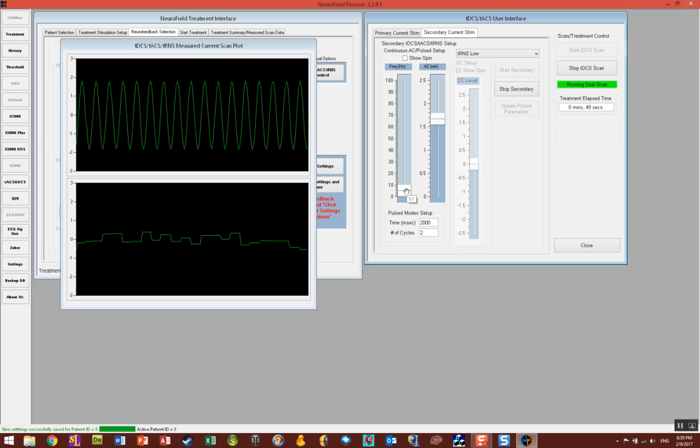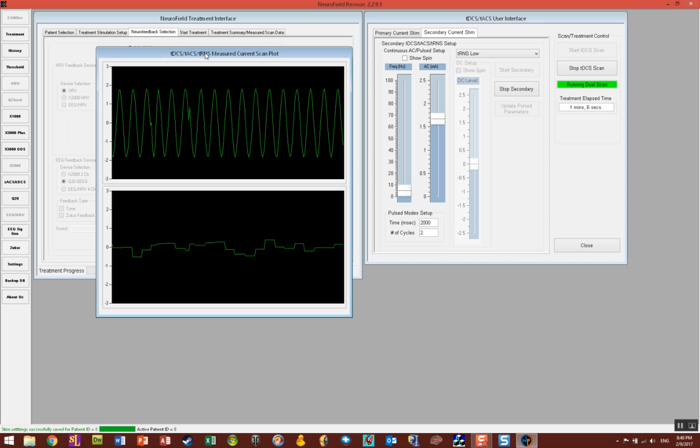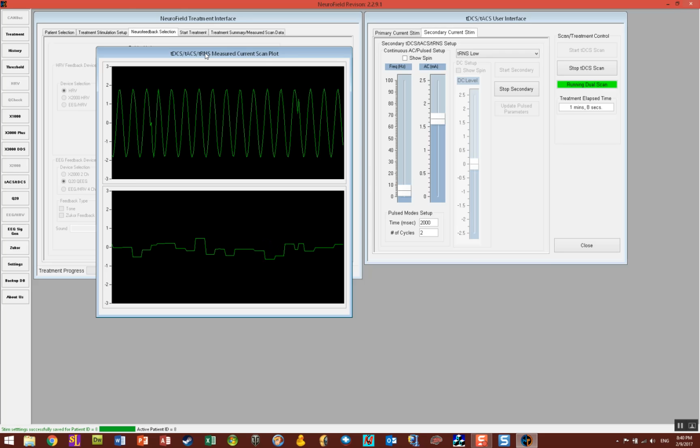And random noise is kind of like a dehabituator. It will decouple and destabilize the system. So it's a way to get the brain ready for a linear treatment. Okay, that's how you use the random control in NeuroField64.